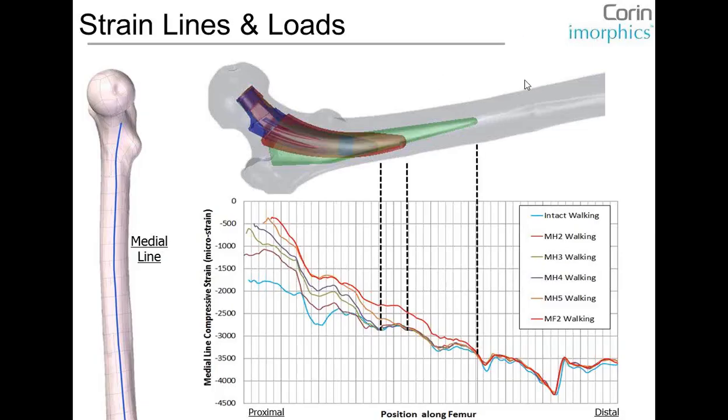So the further away these curves are, for example, the red line, which is the Metafix 2, from the blue line, the worse the bone remodeling response. Okay, so obviously in this particular case, mini hip 2, the brown line, is actually a better model in terms of response inside the body. However, we did this study and we found something very interesting.